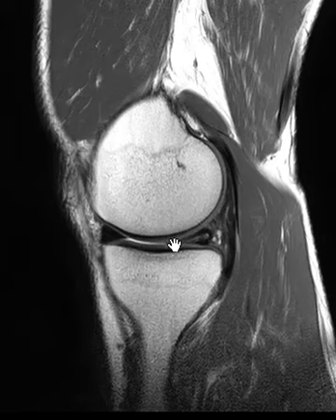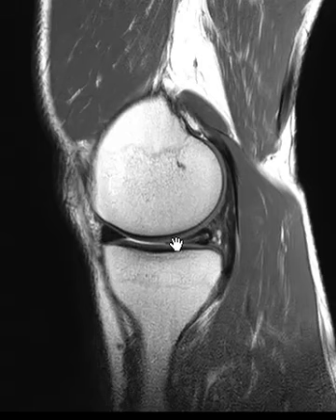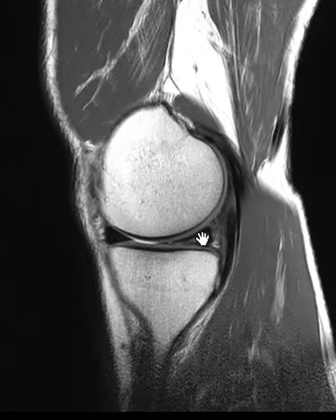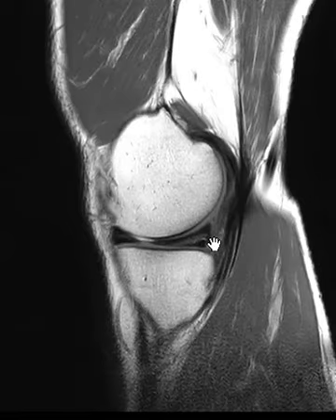So the signal that's longitudinal, this is just what we call degenerative signal or intrasubstance signal. It doesn't touch the top or the bottom. So if the surgeon went in there with a scope and looked, it would look nice along the top and it would look nice along the bottom. This would be invisible. So we're careful not to call it a meniscus tear, though it looks like a tear.